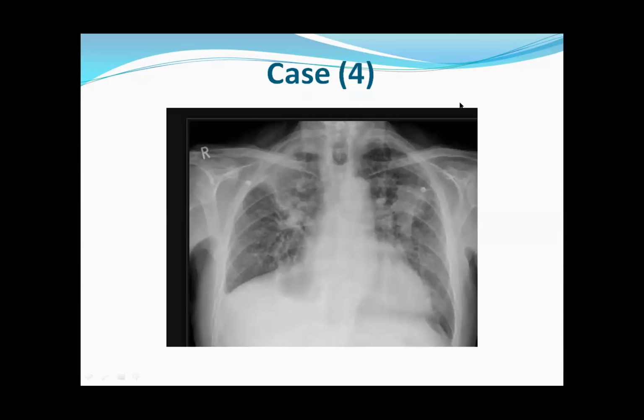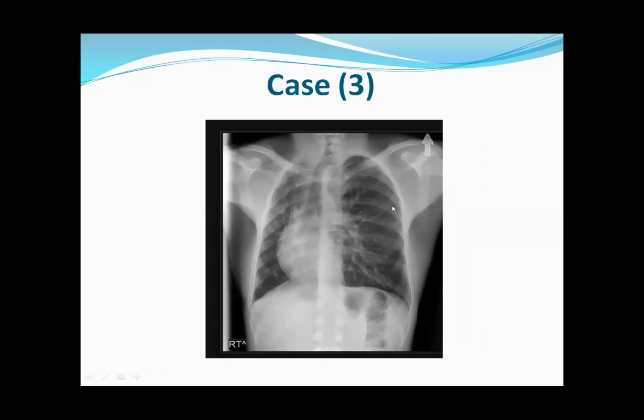This one, you can say upper lobe lung fibrosis. Differential diagnosis: this mass-like lesion because of massive fibrosis, first possibility silicosis. First thing you should ask about is the occupational history. Differential diagnosis: bilateral bronchogenic carcinoma, but less likely, so you can do a biopsy.